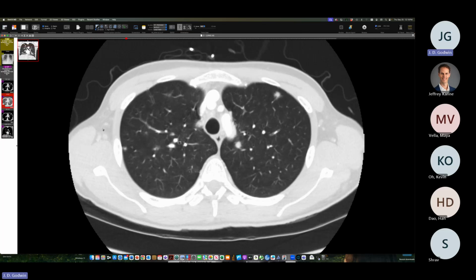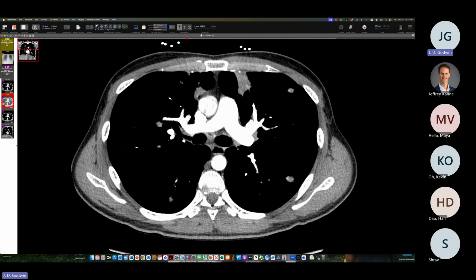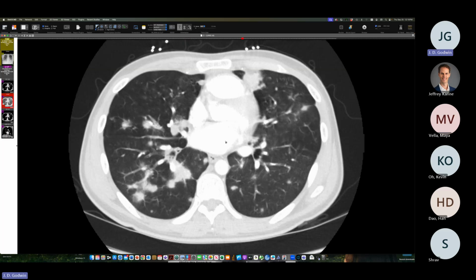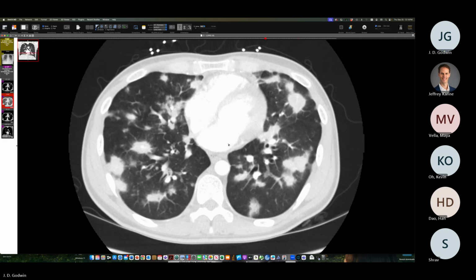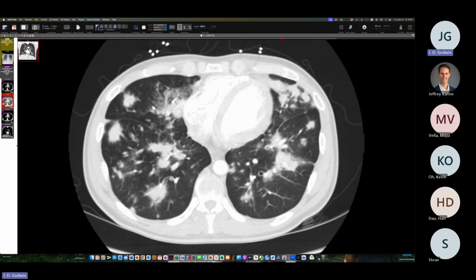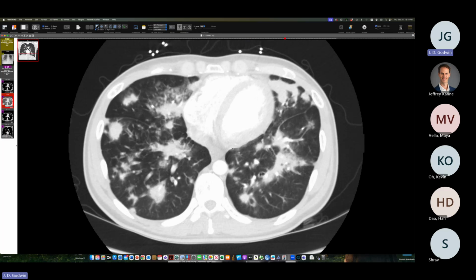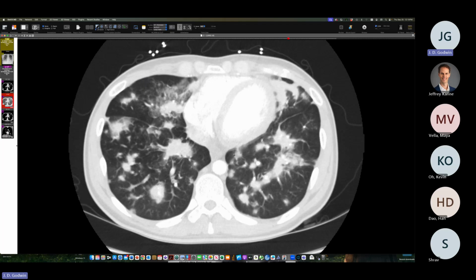And there's a fair amount of sort of amorphous lymphadenopathy here, not well boundaried and stuff like that. So with this fatigue and weight loss, it turns out he has no lymphocytes. And this was Kaposi sarcoma as a presenting manifestation of HIV/AIDS.